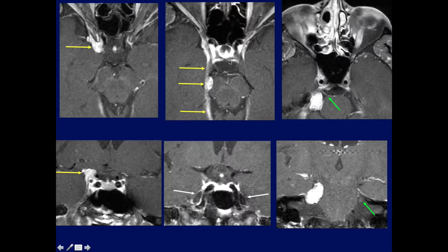And just to show you this route of invasion, here we have an anterior clinoid meningioma, the enhancement of the free edge of the tentorium, and look, there's now also a second meningioma posteriorly indenting the brainstem. So these are two separate meningiomas, although we can see the thickened, enhancing free edge of the tentorium, most likely the route by which either of these develop along the tentorium and cavernous sinus wall.